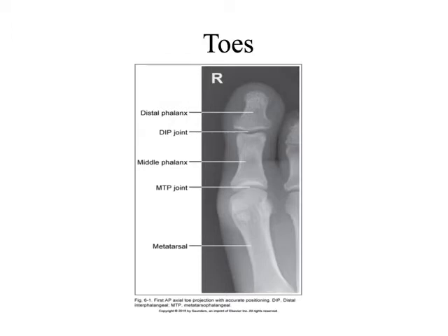So this looks like a digital image. We have a digital marker on it. What else can we say about this picture? Let's talk a little bit about this picture and use kind of the same criteria that we were just talking about to describe what we're seeing on this image. What are we centered on?